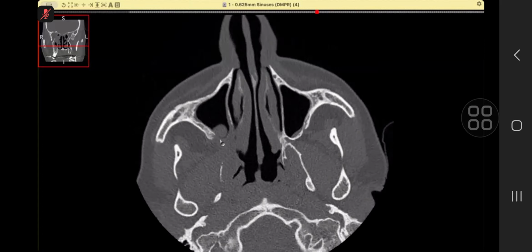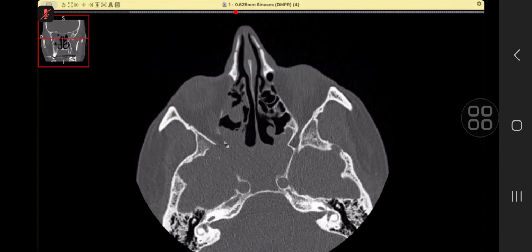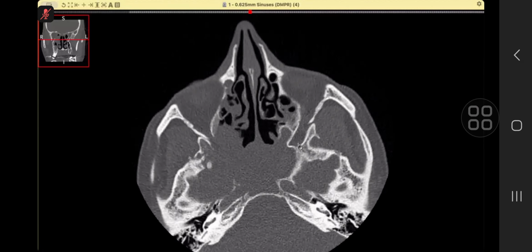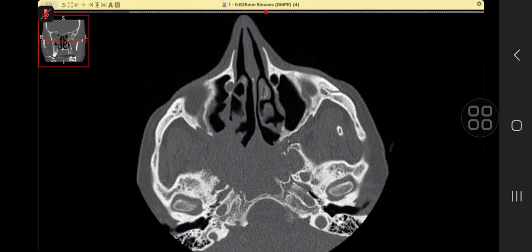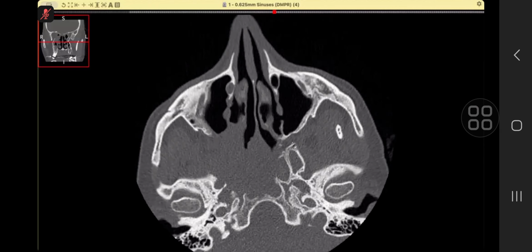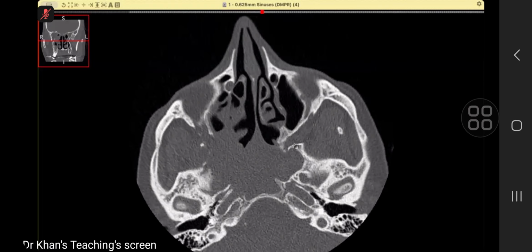So that is a huge tumor, and of course, another point is that let's cover the anatomy of the pterygopalatine fossa in this case, on the normal side, right? So basically, pterygopalatine fossa is okay.